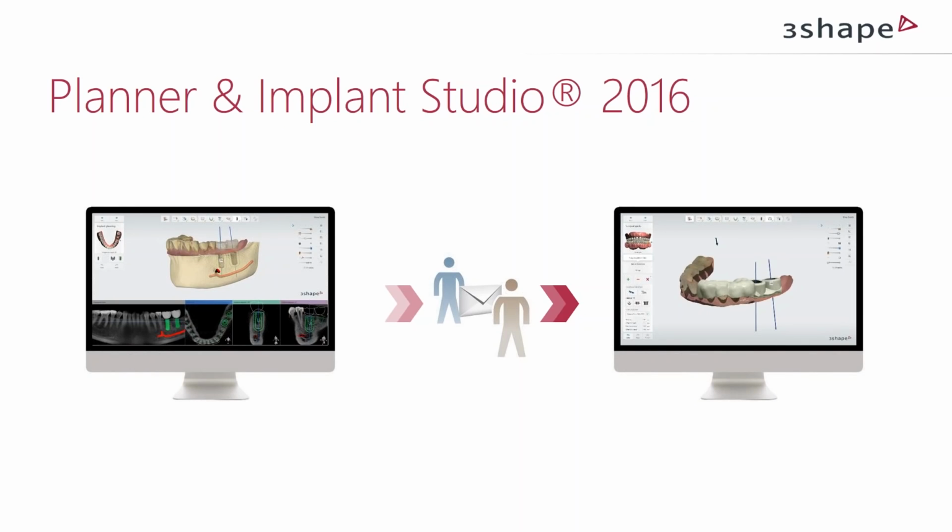because they are specialists in how it looks in the mouth. They know how they want the implants to be placed. So they can work with this, get their exact positioning of the implants and everything, and then send it over, communicate to the laboratory for the guide design. We have the same feature in our ortho software as well, that we can actually have it in two pieces.